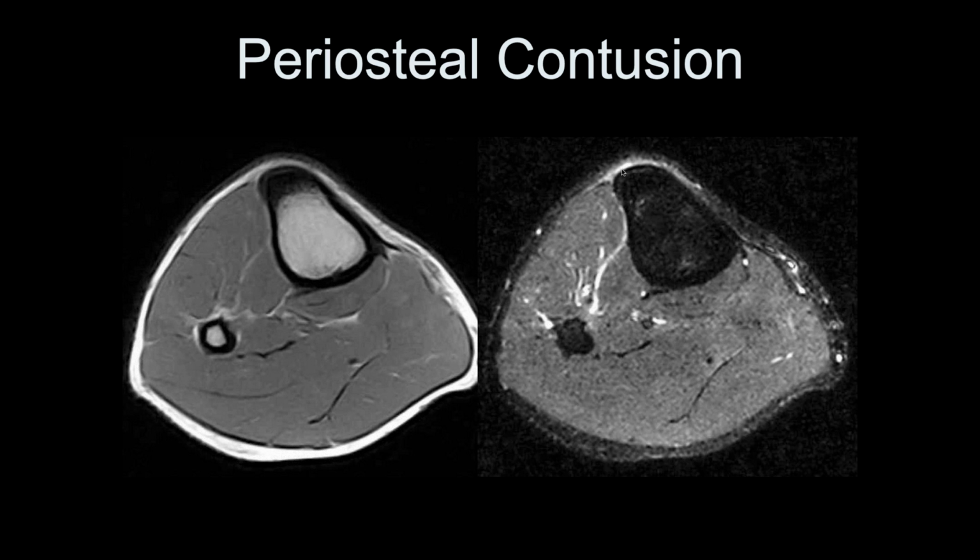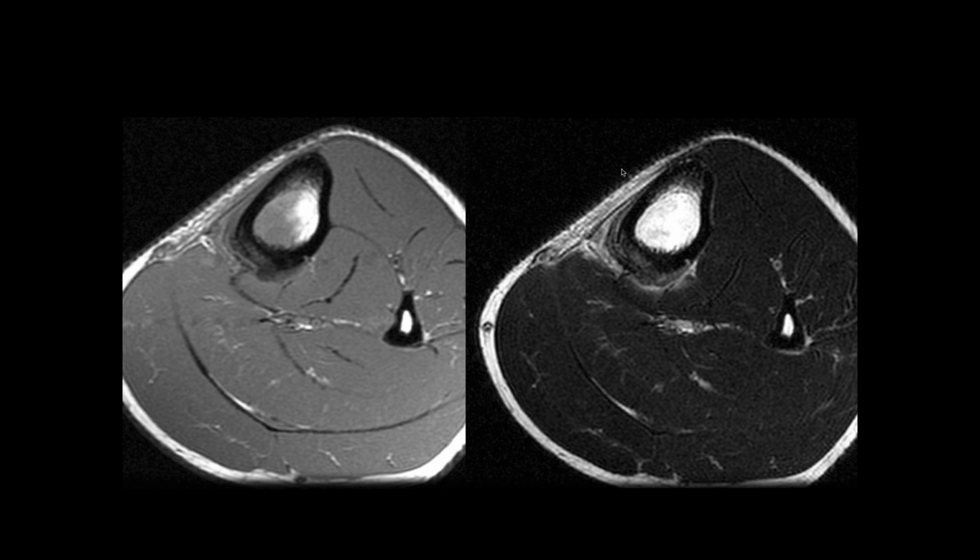John? I was going to say on that last case, I was totally wrong. I was looking at the marrow rather than the outside of the bone. That's posterior medial, and that's an interesting injury. How do you get away with that without hurting the muscle?